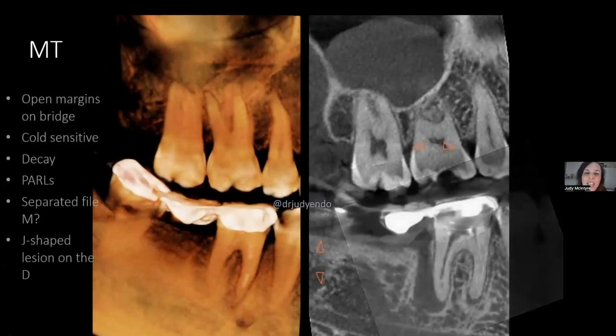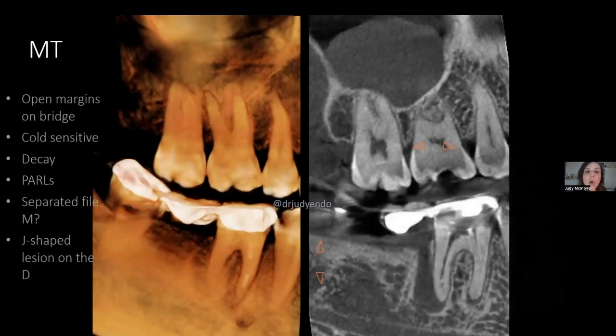With 3D imaging, however, we get a whole host of extra information. So here's that J-shaped lesion, right? "Oh my gosh, it's fractured," would be anyone's conclusion. However, when I look more closely at this J-shaped lesion, I'm keen to focus on this little spicule of bone.